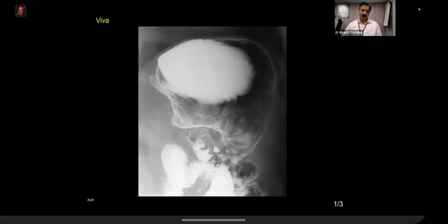So the configuration of the stomach is abnormal. I can't identify the pylorus and the duodenal cap. There are loops of jejunum inferiorly, so I would correlate with any history of surgical procedures, in particular formation of gastrojejunostomies. Gastrojejunostomy. Okay, fine. Let me take over because of the time factor.